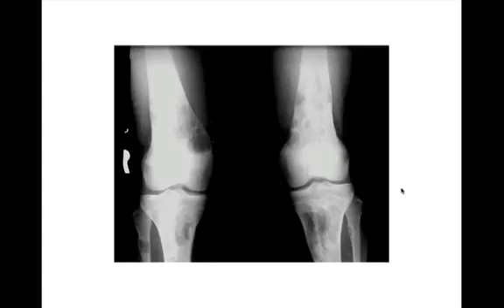Okay, so frontal radiographs of both knees. We saw a close-up of one of these earlier. So if we take one of these lesions, we have a geographic lytic lesion with a narrow zone of transition and sclerotic border, which is cortically based in the distal femur in the metaphysis, and then multiple similar appearing lesions throughout the left side, as well as the right proximal tibia and proximal femur.